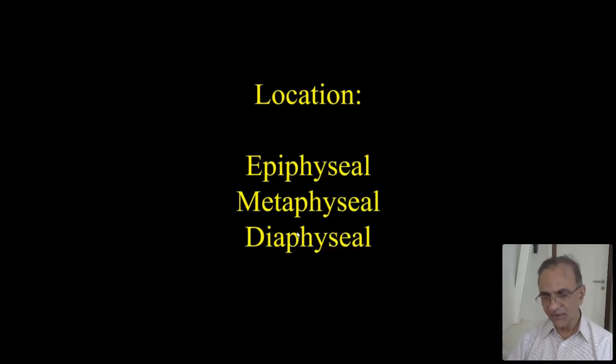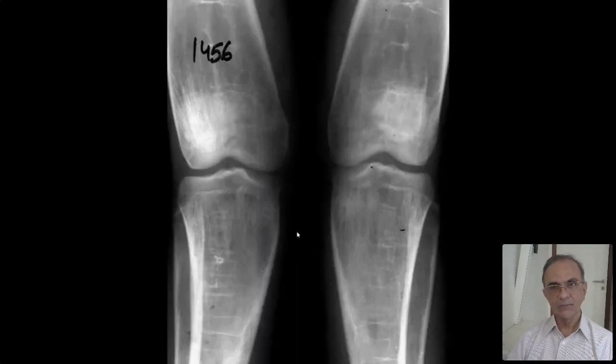So when you look at that, this is what I call non-tubulation of bone. All of these are from the teaching files of the KM hospital. Look at 1456. Exam 1456, you make a diagnosis. Non-tubulation of bone, the so-called Erlenmeyer flask deformity. Why Erlenmeyer flask deformity? Google.